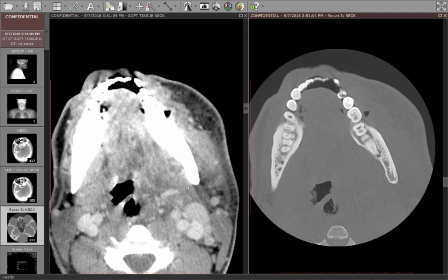But you really don't want to overlook the possibility of a tooth infection. And this can be missed clinically very easily. The patient complains of a sore throat. You look in the mouth, there's swelling of the pharynx and of the tonsillar area. So it's reasonable. It also can be missed on CT imaging. I mean, you really have to pay attention to this area of the mandible. Notice that there's a subperiosteal collection here, and notice that it's associated with the decayed tooth.